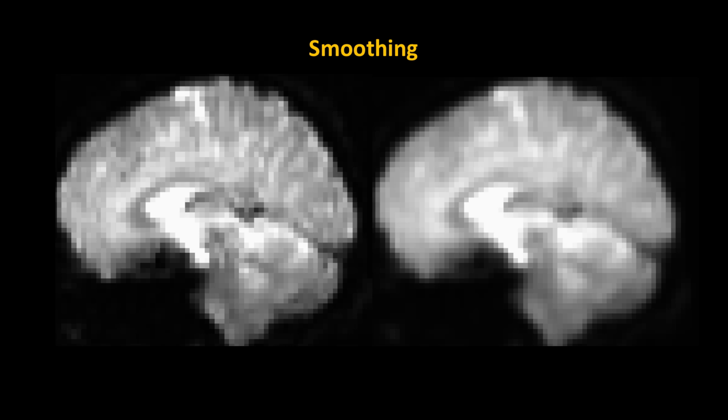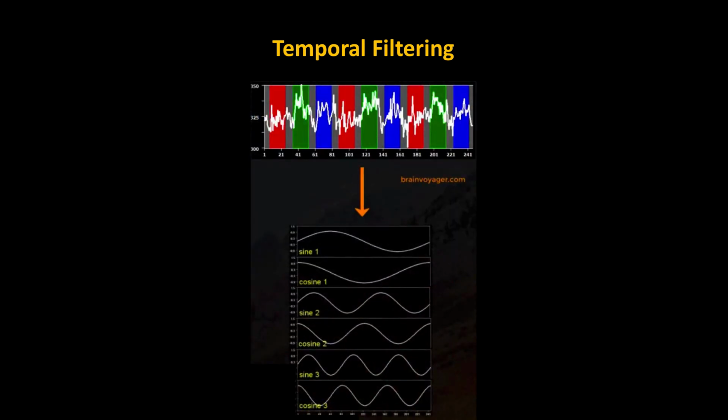I'll say that it's recommended in the CONN toolbox. That's what it's going to do. So you'll have smoothed images, but be aware that your analysis may not necessarily use the smoothed data. Okay, you can choose to do that later if you want. Yeah, whatever the step was before the smooth. And from what I recall, smooth is the last preprocessing step done, so you should be okay.